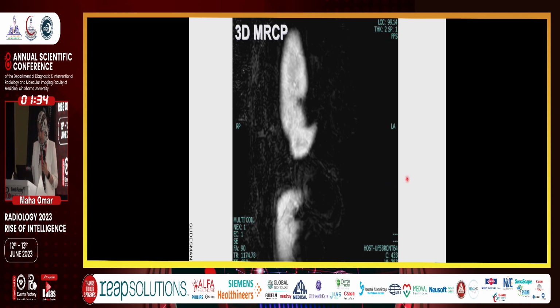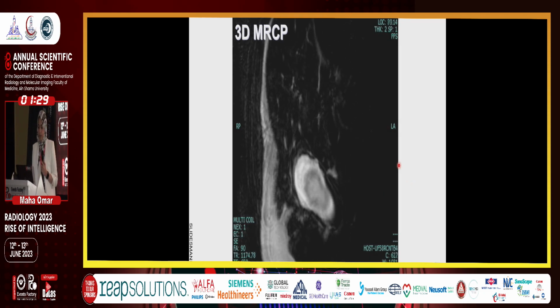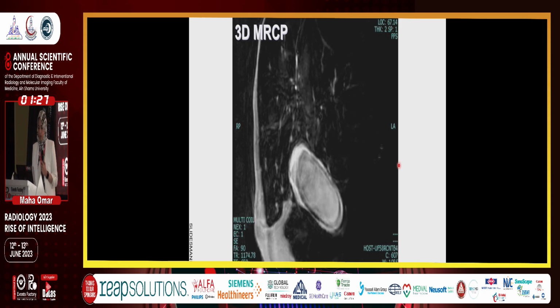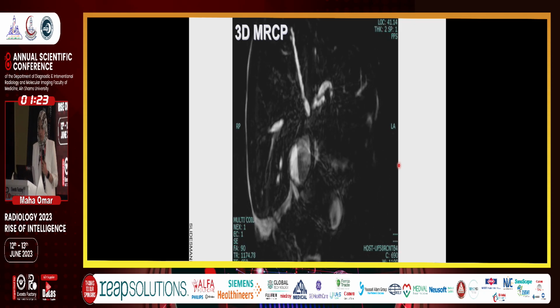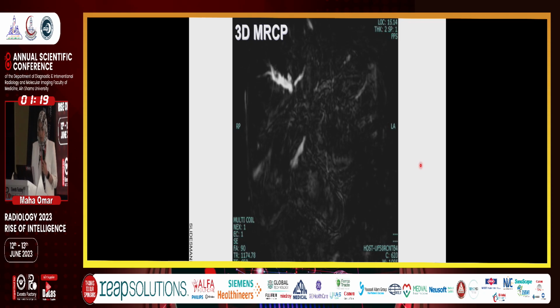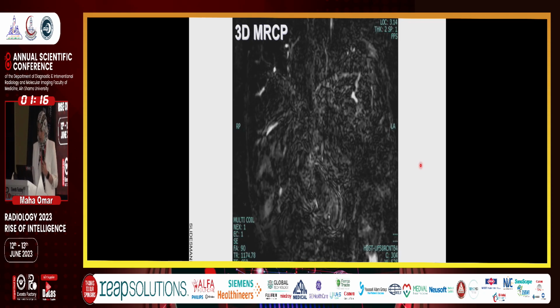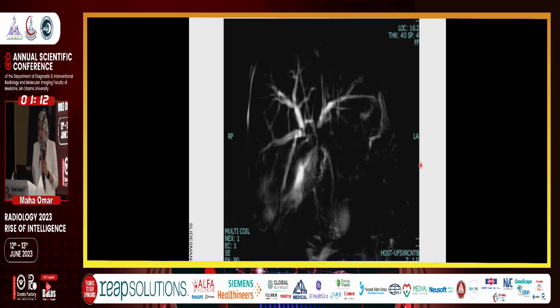This is the 3D MRCP study. Okay. The MIP MRCP images.